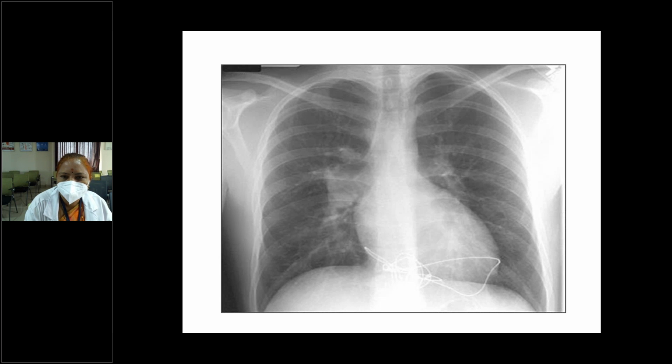Ma'am, this is a plain X-ray taken in PA view showing the chest. Name, I want your name. Ma'am, Bharadwaj. Okay, good. Read. Skin and soft tissues are normal. There is adequate exposure. There is obscuration of the left heart border margins. Costophrenic angles are normal on both sides. On the left side, it's slightly elevated.